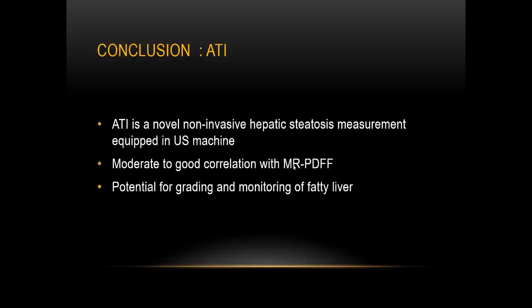Significant fatty liver. So in conclusion, attenuation imaging is a technique or application equipped in ultrasound machines. It has a moderate to good correlation with MRI-PDFF and can potentially be used for grading and monitoring fatty liver.